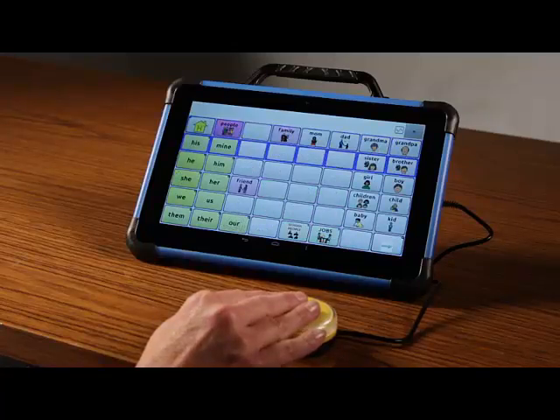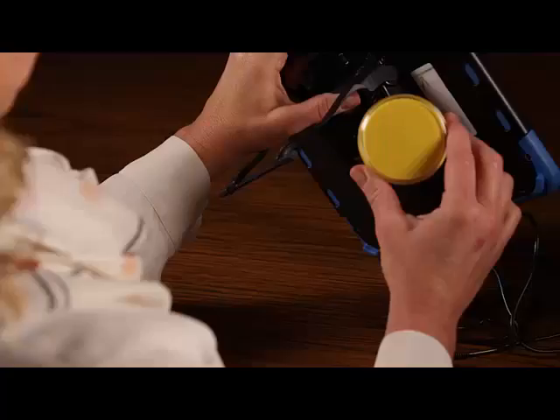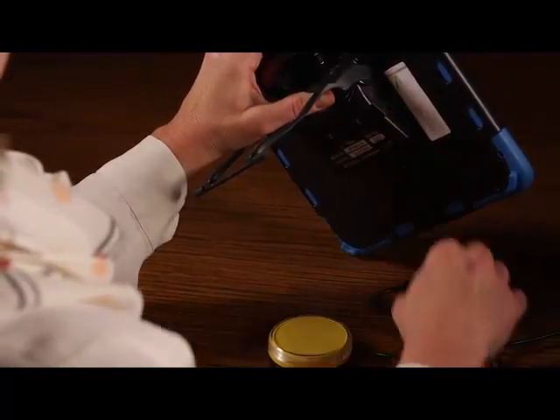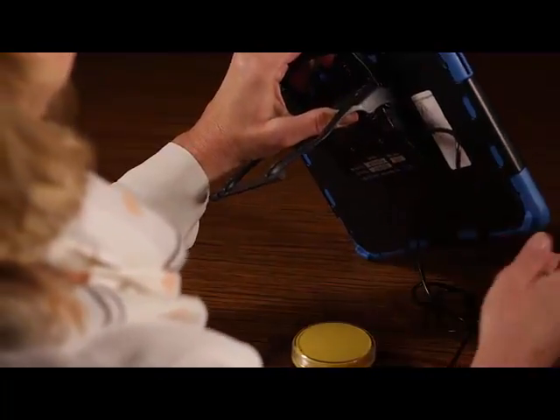Let's take a look at setting up the scanning system. I will move through the features of the single switch setup first, then dual switch. First, I will connect one switch in port A on the device. Next, I need to turn scanning on.